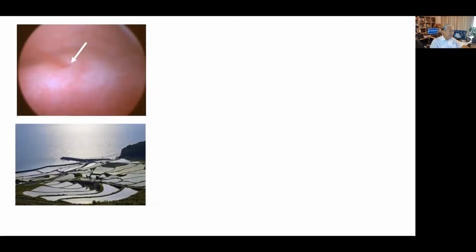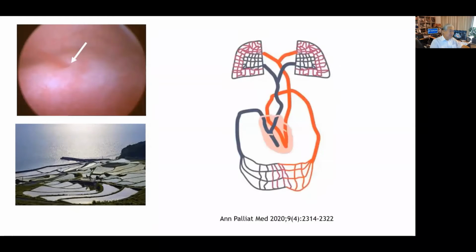Water at a higher level naturally tries to flow down to the lower level. Likewise, left renal vein hypertension due to Nutcracker phenomenon causes development of various collateral vessels to transfer blood from the left kidney across the midline to the right-sided inferior vena cava.